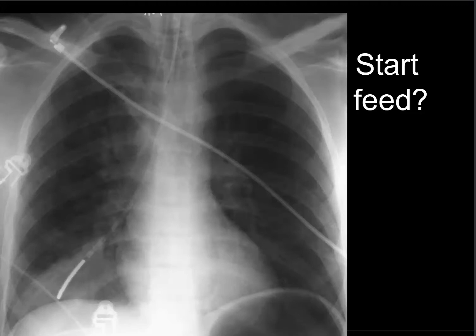How many lines can we see on this X-ray? You can actually see 4. One here is of no consequence. It's just a line, perhaps an ECG lead. I think there's a sort of connection here. The second line is this ECG line going across, obscuring the image, but for us, we know it's outside the lung, so of no significance to us.